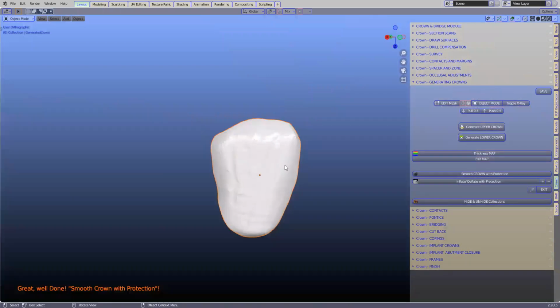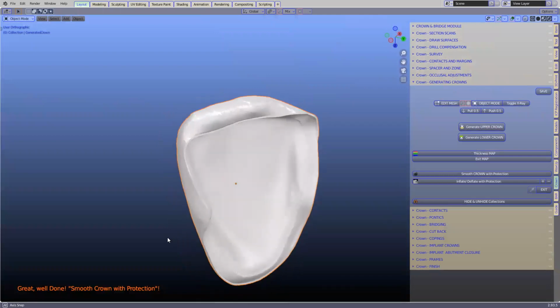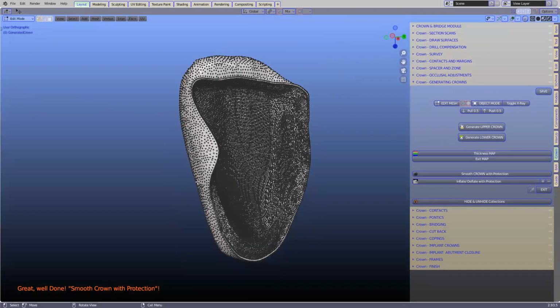Now, these denture teeth are quite textured, if you see, but this is the mold that you can actually purchase from the factory. Once it's polished and everything, it comes directly textured from the denture card as such. Correct, and you can smooth it down if you want.